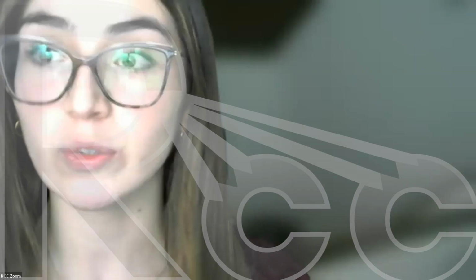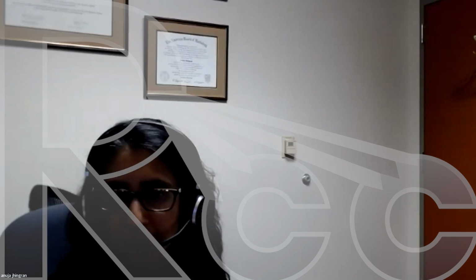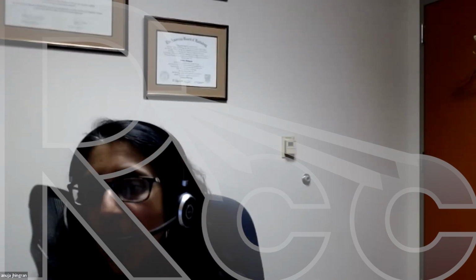Do you prescribe it at the surface, or do you use 0.5 centimeters? No, surface. We always prescribe to the surface. So we do 6 gray times 5 to the surface. Okay, to the surface. Yes, to the surface.